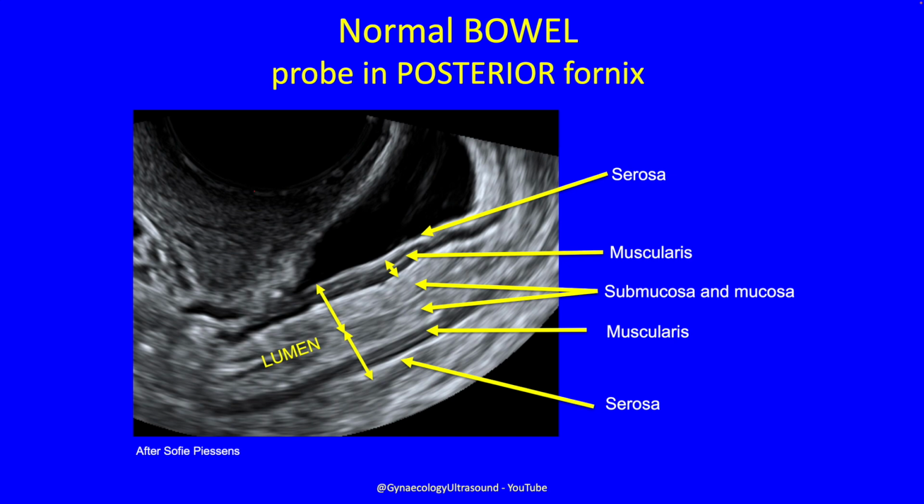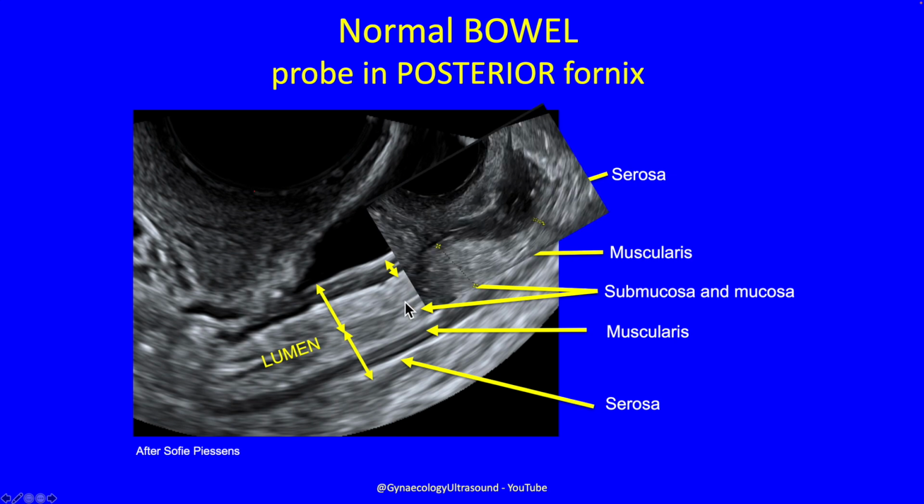Now, very important when you're looking for endometriosis to be able to recognize this triple layer, because this becomes abnormal in nodules, bowel nodules of endometriosis. That's what they look like. You've got that normal triple layer going in, the normal triple layer going out, and this is a bowel nodule of deep endometriosis where that muscle layer has become very disrupted by endometriotic tissue causing fibrosis.